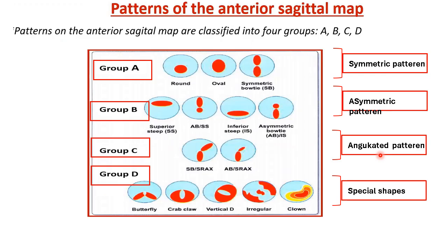I just give an overview generally, and the details are available in any source you can follow. What I would like to highlight is the importance of the axial map in determining the power of the cornea and the curvature, and in determining the pattern of astigmatism.